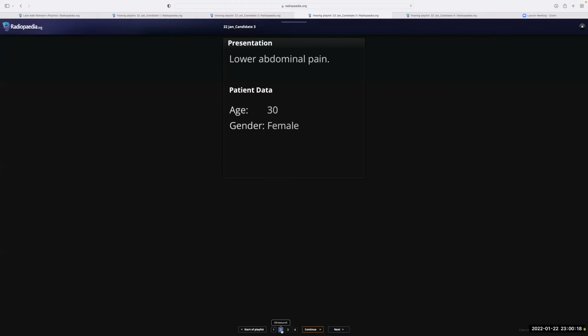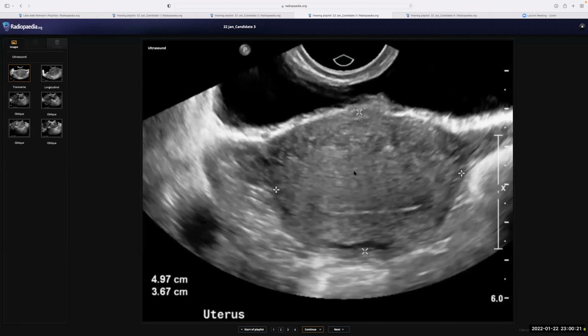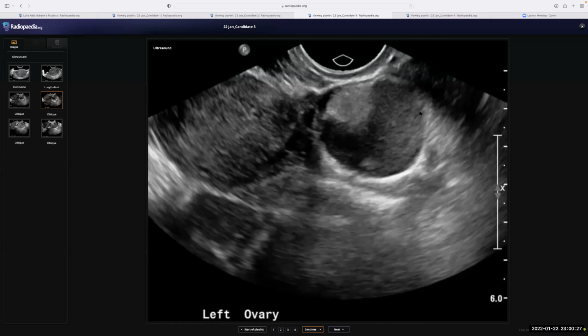And lower abdominal pain in this patient. So the uterus was fine. Yes, I agree. There's some heterogeneity here. But here, when looking at the ovary, you can see that the ovary is heterogeneous, and the echogenic part is on top of the hypoechoic part. This is a sign that is suspicious for fat content. Even if you're not convinced, put it in the differential as well. So you say it could be torsion, it could be an ovarian dermoid, it could be an abscess. If the inflammatory markers are normal, then we are left with the two other possibilities. Either it's a simple dermoid, or a torsion.